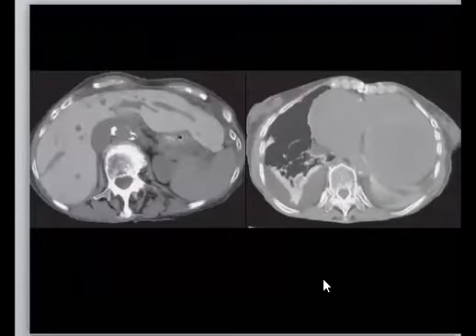This one is important to know, and they like it in the exams, because you have this congenital, traumatic, inflammatory, neoplastic scheme, and we always forget that one of these items you should think of in your differential is drug-related or medications, right? So this one can be from hyperdensity in the liver, diffuse hyperdensity. It can be from something called amiodarone therapy.